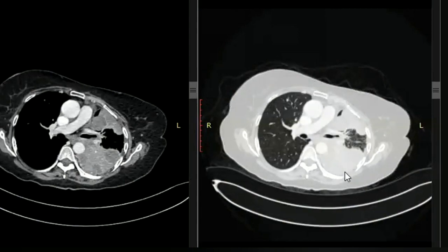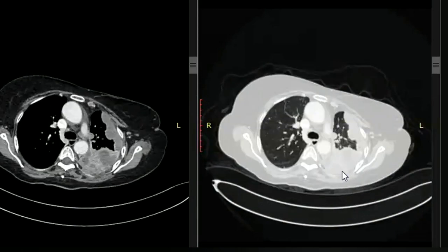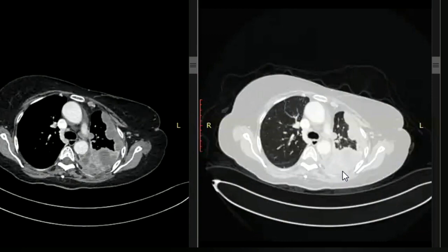I can appreciate that there is a soft tissue, fluid density mass identified in the left lung field, and it has enhancing walls and internal nodular bubbly margins, and it has somewhat underlying lung collapse component in the lower zones as well, and it is surrounding the lateral wall, posterior, as well as the majority of the mediastinal pleura.